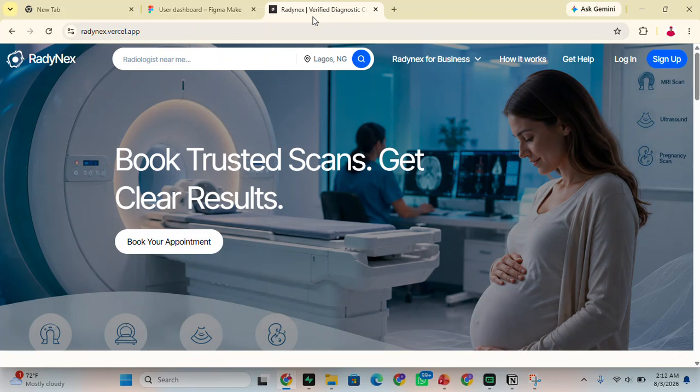This is Mednova, but currently we've changed the name to Radinex, a medical radiology intelligence platform. And Radinex, we have two sides. We have the patient side and we have the client side. That is Radinex for business. Yes, we registered as Mednova, but due to the use of Mednova by many sites, we changed it to Radinex. Now, this is the patient side.